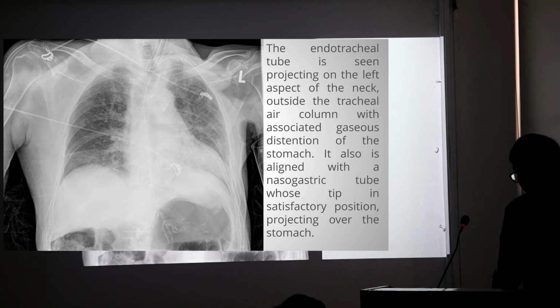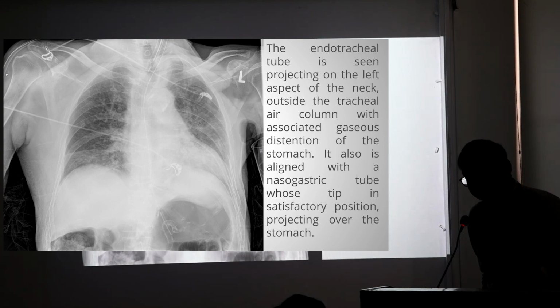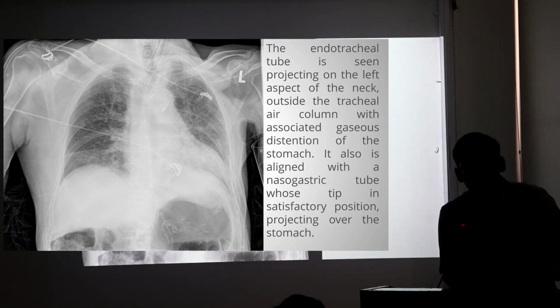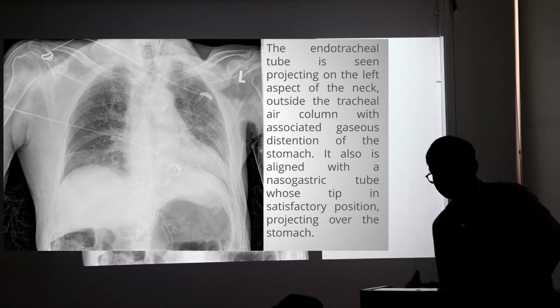Now coming to this, a very important X-ray. We should all be very careful. What has gone wrong in this X-ray? Somebody has intubated in the emergency and the patient is not maintaining saturation. So this is the clinical history of this patient. Can anyone please volunteer?